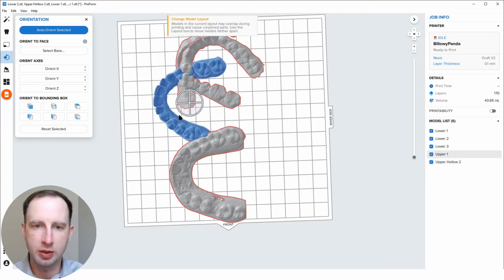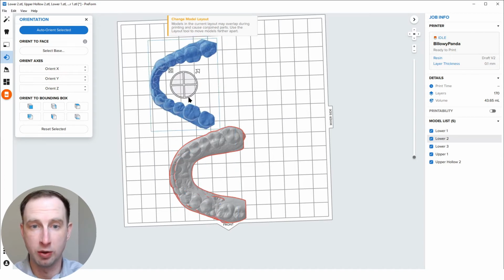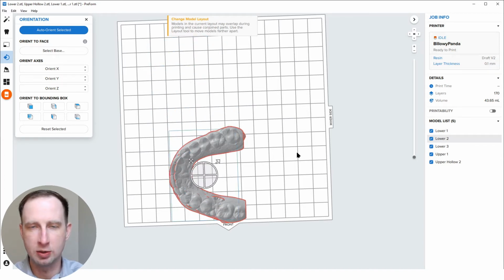And if it's not the correct rotation, I'll just grab that edge sphere and put that into place like so. Again, not the end of the world if it's not exact, but you want to be pretty close and have them one over the other, like what I'm doing here. So I'll just rotate that a little bit. Once ready, drag it over.